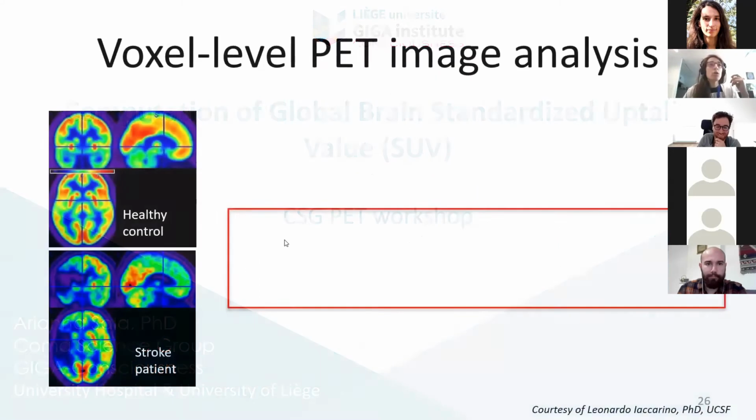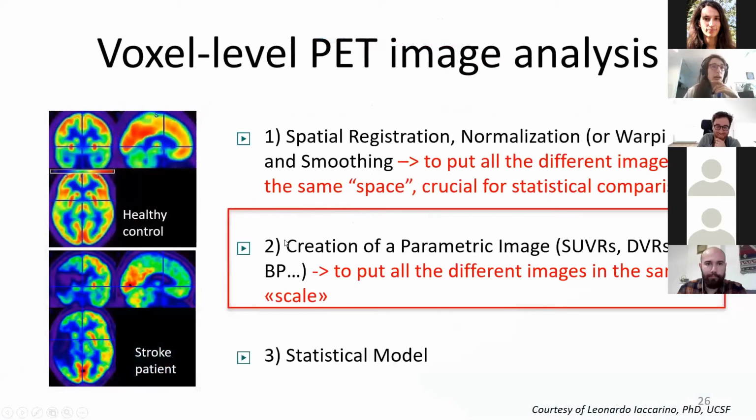Okay, so for the SUV part, the thing with SUV is that, as you saw, we cannot just take the image containing the radioactivity, because the radioactivity is influenced by many things: patient weight, time from injection, etc. So we have to use a standardized measure, that is the SUV in our case, the standardized uptake value that Tommaso talked about and that Claire showed you how to compute.